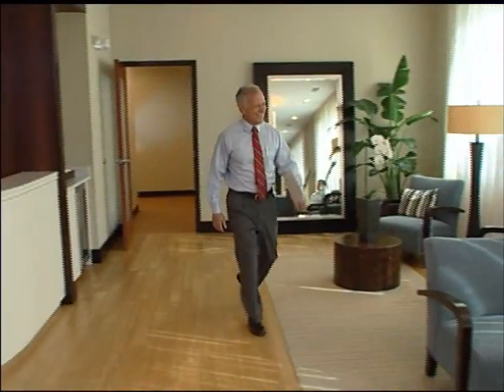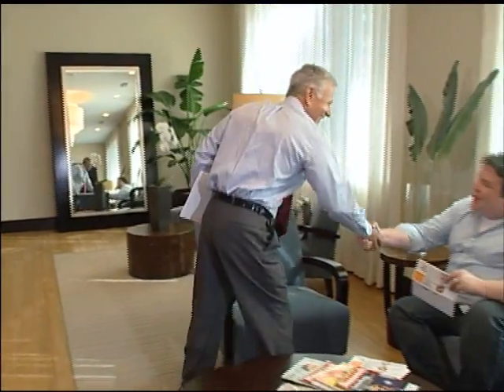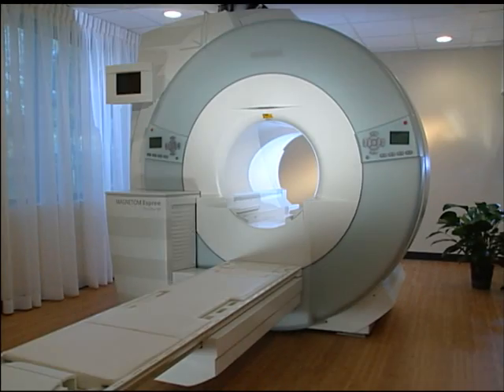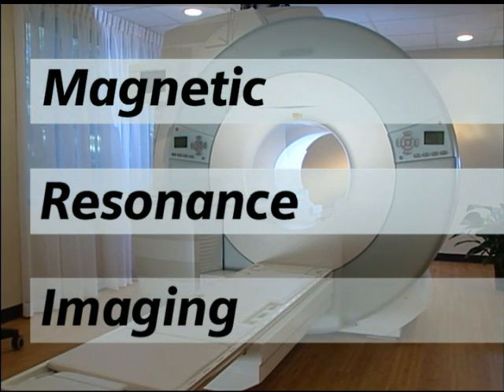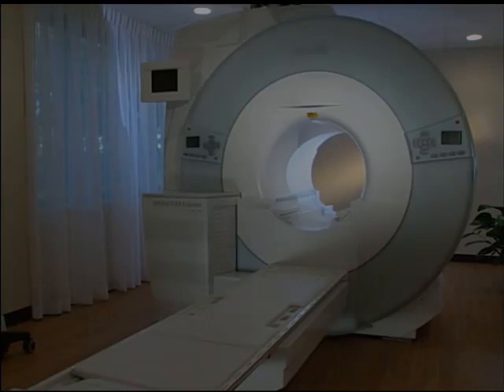Welcome to this MRI patient education videotape. Your physician has ordered an MRI medical exam. What is MRI? MRI stands for magnetic resonance imaging, and for the next few minutes, we'll discuss the MRI examination.